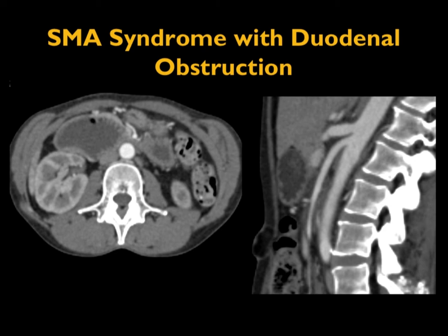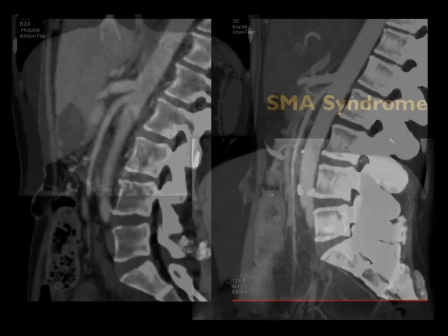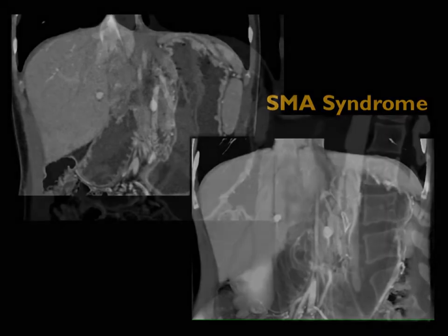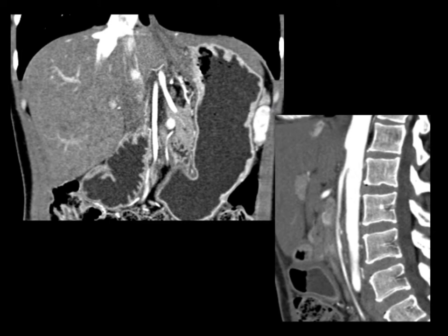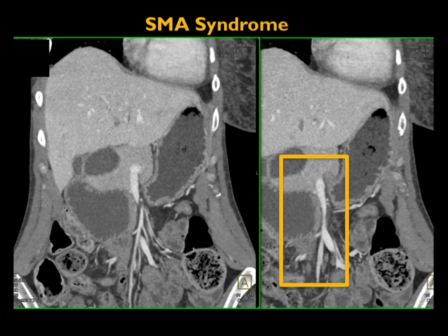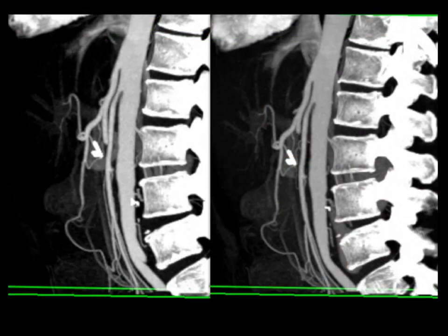Sagittal view, you see the angle of the patient's SMA, and here it is again. Or this case, again, dilated duodenum coming to midline. There's the SMA. It's obstructed at the SMA. And here again are just some of the angles showing you the information, but the importance of looking at the bowel as well to make things a syndrome. Or in this example, you can see this narrowing of the SMA angle, but there's a duodenum coming right to the point. And then here is what it would look like on the sagittal view. So just a very nice example.